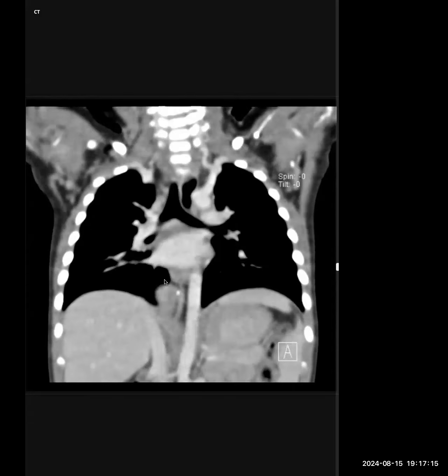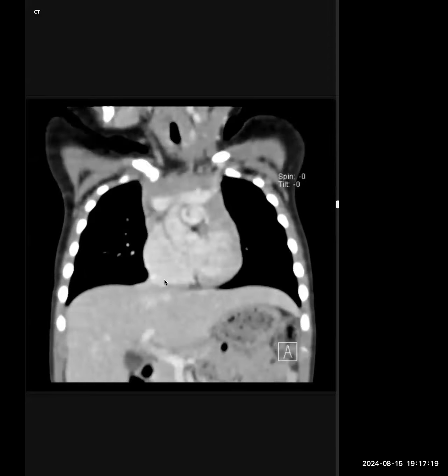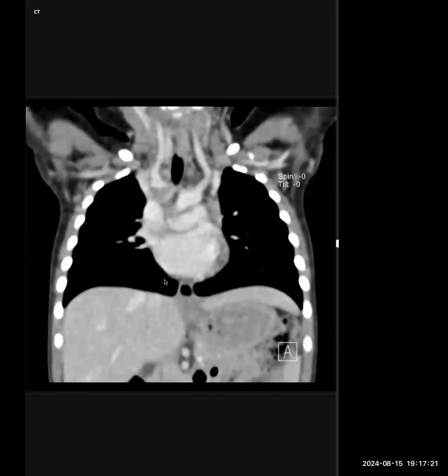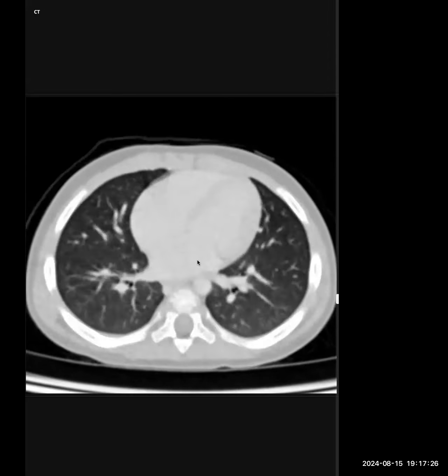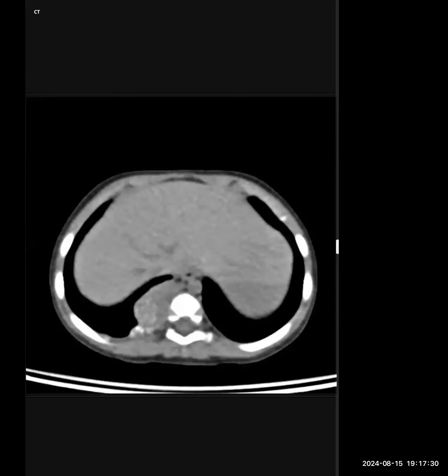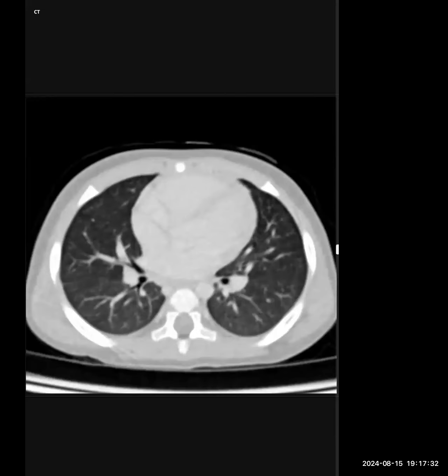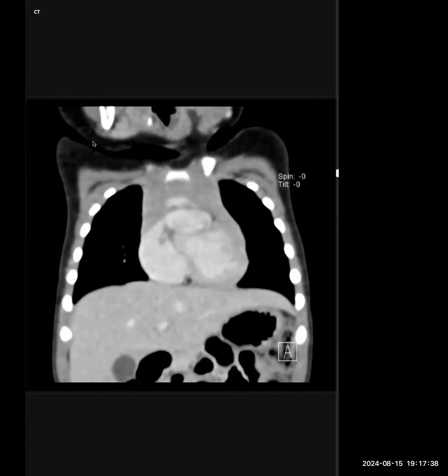This is another case where I thought that you added a lot of differentials. No, this was not differentials. So you started with this one, and you said this was a contrast enhanced scan. So be very sure about what you're saying. The first lung window was actually part of the non-contrast scans, and then I gave you the contrast enhanced scans. So just be very careful about what you're saying.